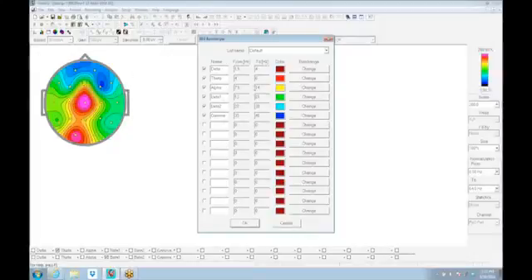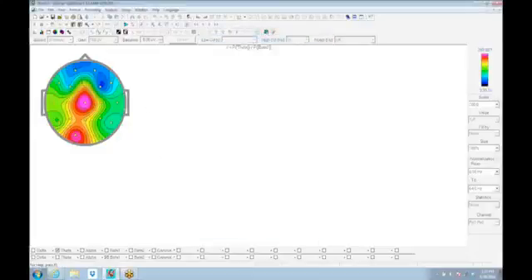If you don't have these settings proper, and I had to tweak these to get them to match, this by default was at 7.5, alpha from 7.5 to 14, and 14 to 20. So I had to tweak the beta 1 to match it up again to make the theta-beta ratio valid according to the theta-beta ratio in the Monastra, Linden, Lubar paper.